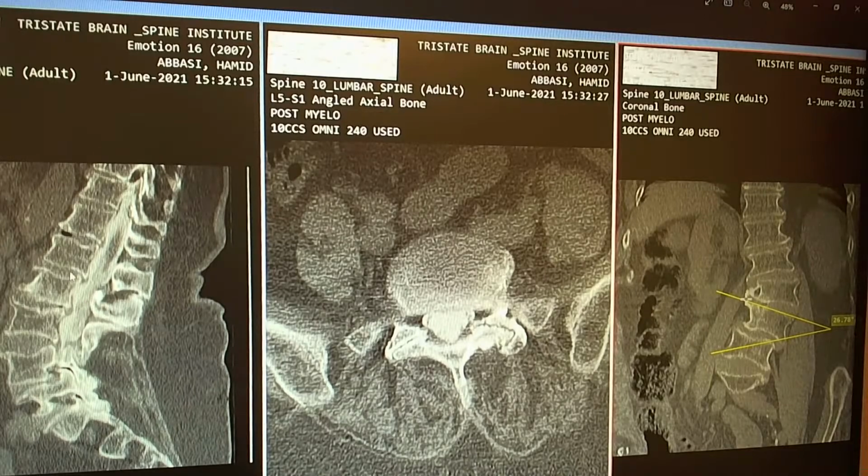And here in the sagittal view, you see bone, disc, bone, disc. You see air inside of the disc space. Now, who can tell me where in heaven or earth air gets inside of the disc space or even inside of the facet? How does air get there?